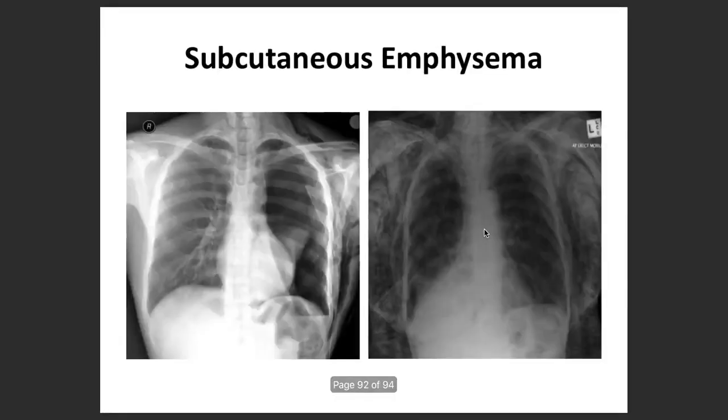So emphysema or COPD, you all are already aware. It mostly refers to hyperinflation, which is commonly present, and yes, the bullae or the avascularity is present, especially in the peripheral third of the lungs, which I already explained, the emphysema and the subcutaneous emphysema. So this is the picture which you see classically, especially in COPD patients.